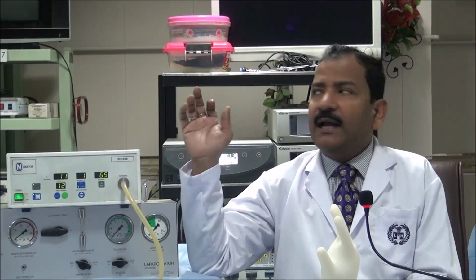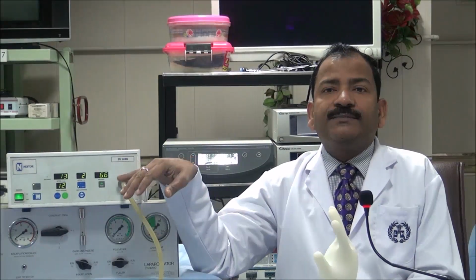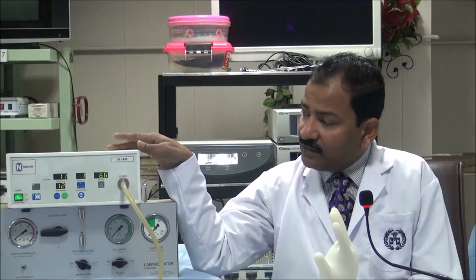And once the pressure is less, it will start flowing. And the rate of flow will be decided by the rate of loss. If the rate of leak is 20 liter per minute, the rate of flow will be 20 liter per minute. And vice versa. And this way you can adjust the flow rate.